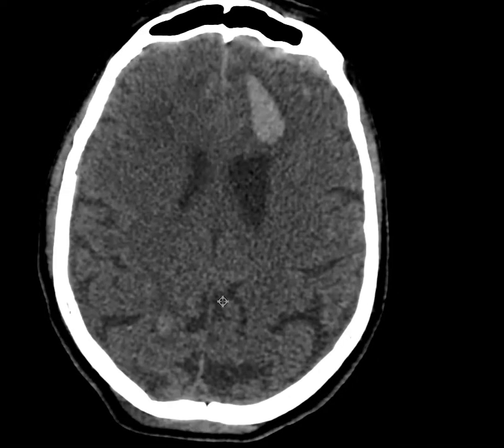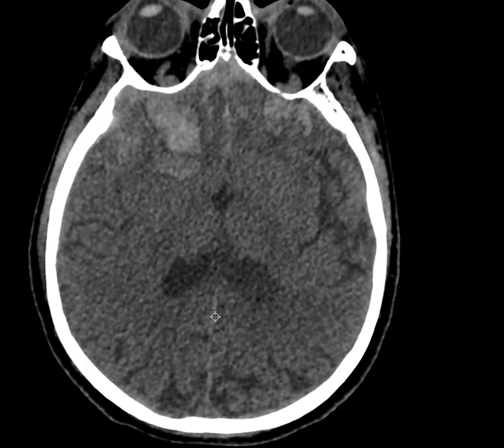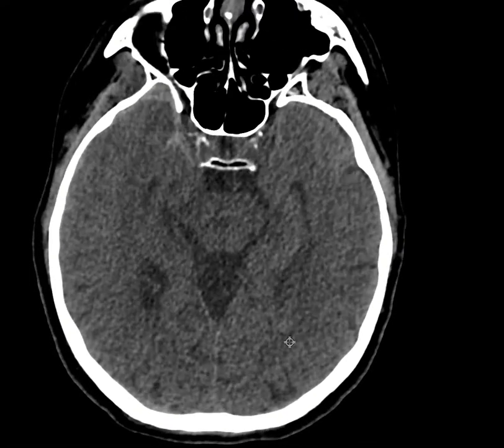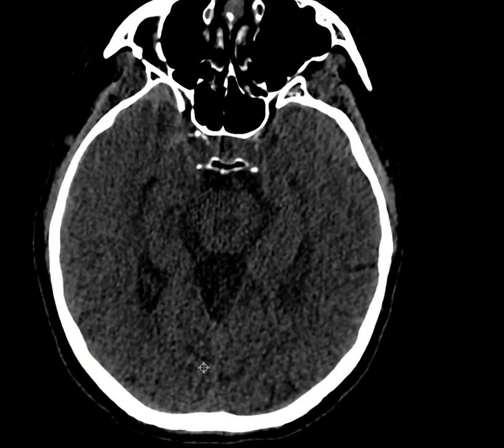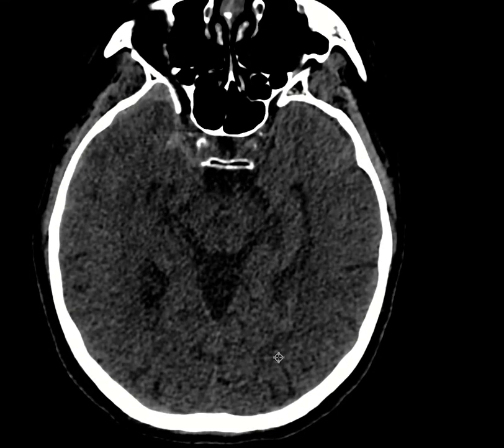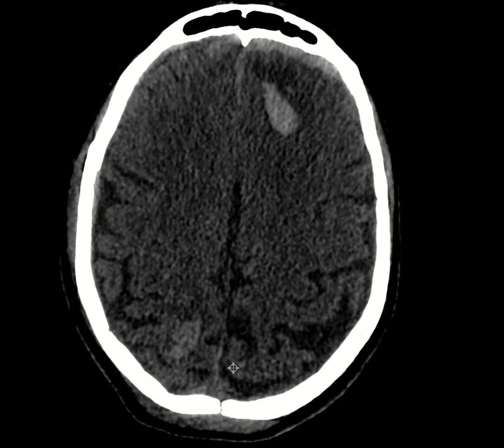When the patient has subarachnoid hemorrhage, we know that's the way they are going to transfer into the ventricles. That's the way the CSF moves in the brain. So we see that this patient also has some areas of intraventricular hemorrhage. If I window it down, you'll see that there is dependent occipital horn hemorrhage in this patient, which is expected. When you have subarachnoid hemorrhage, sometimes, not always, it's expected to have some intraventricular hemorrhage.